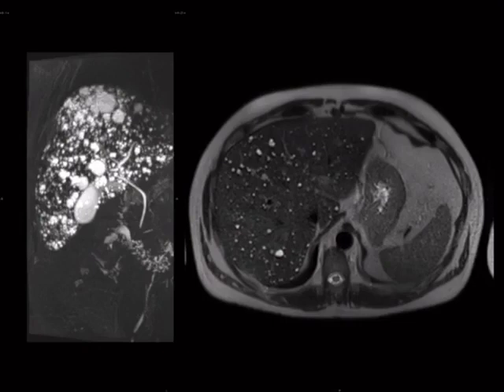So we have an axial T2 through the liver. We definitely know it's a T2. I can see that CSF. And then we've got thick cut MRCP also through the liver. So we got a bunch of T2 bright things, sort of look like they might be cysts.